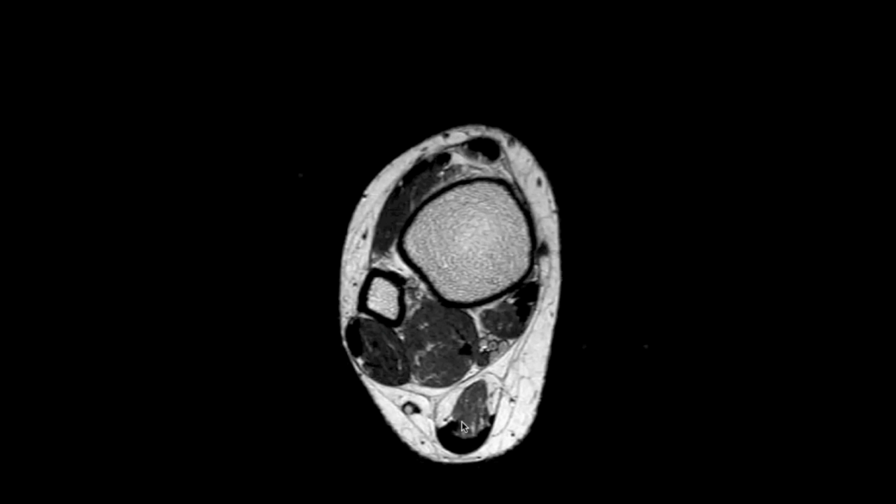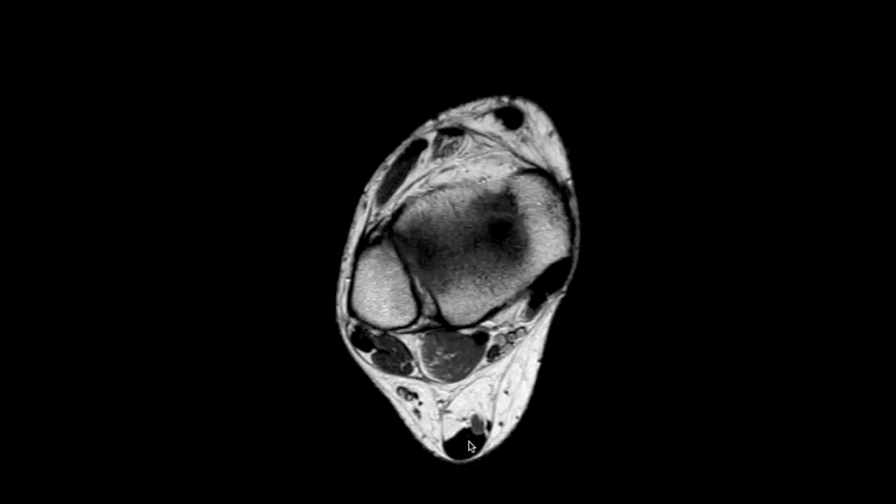When we look more posteriorly, we have our largest tendon, which is the Achilles tendon, and usually we catch some of the inferior fibers of the soleus, which tends to insert more distally at the myotendinous junction. The Achilles does not have a tendon sheath, so it cannot have tenosynovitis, and so it does have a paratenon, and you see inflammation of it in the setting of Achilles tendonitis.